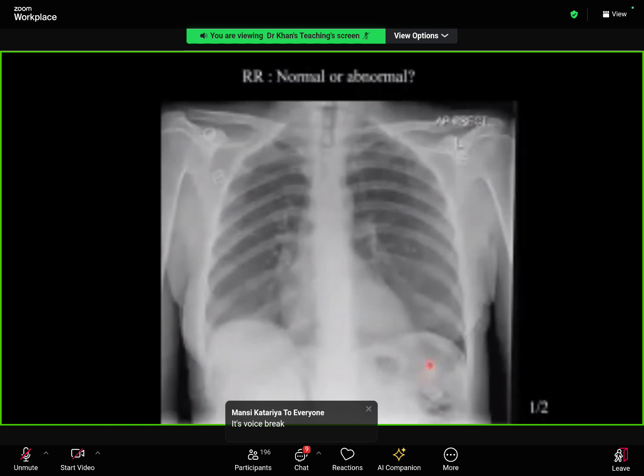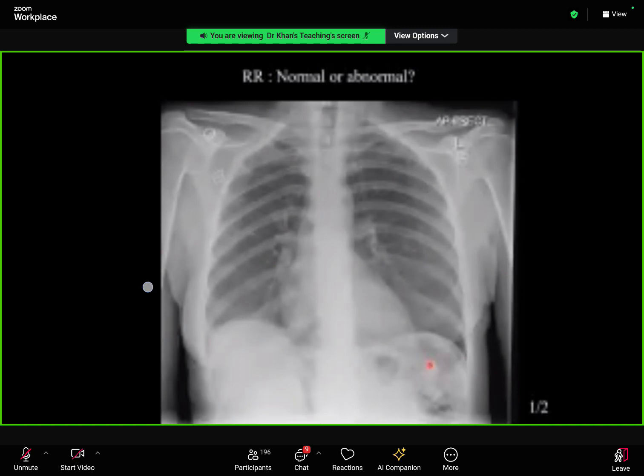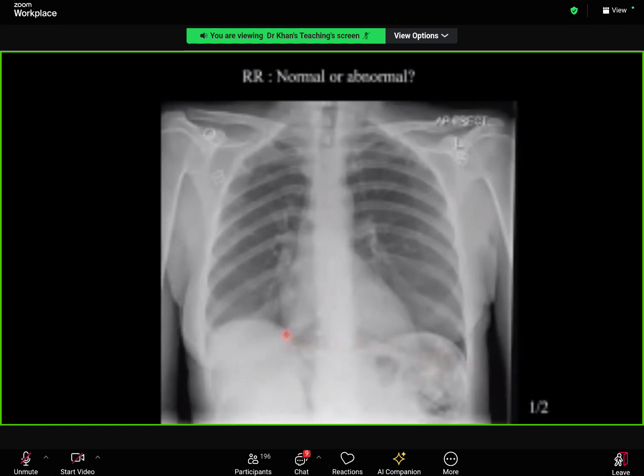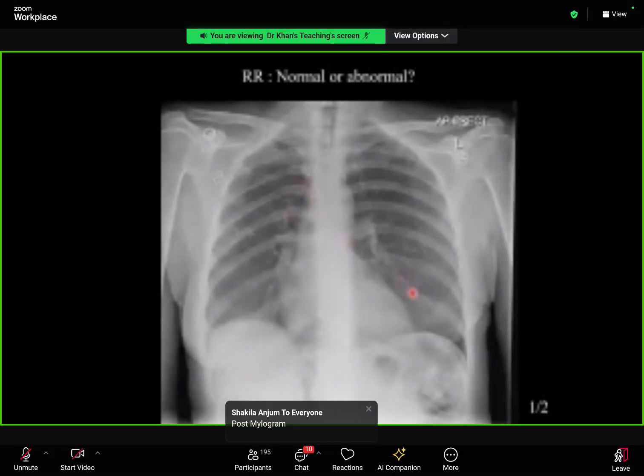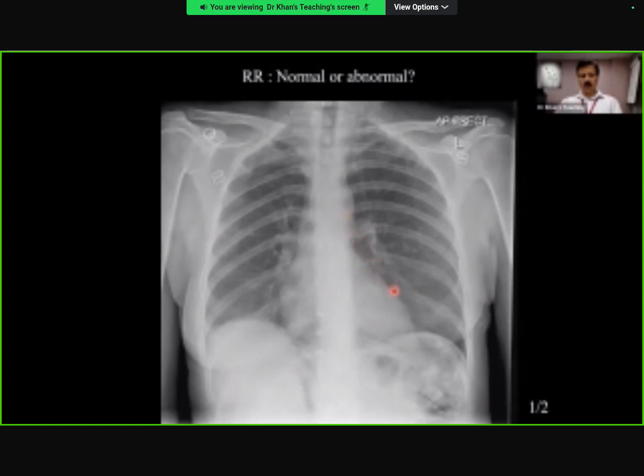Just trying to look for the pneumomediastinum. Excellent. Your thinking is absolutely correct, but where is it? On the right side. In fact, going all the way on the mediastinum. Yeah, there. Not here. Actually, maybe it's not projecting for you very clearly, but actually this is where it is. You can see this pneumomediastinum.